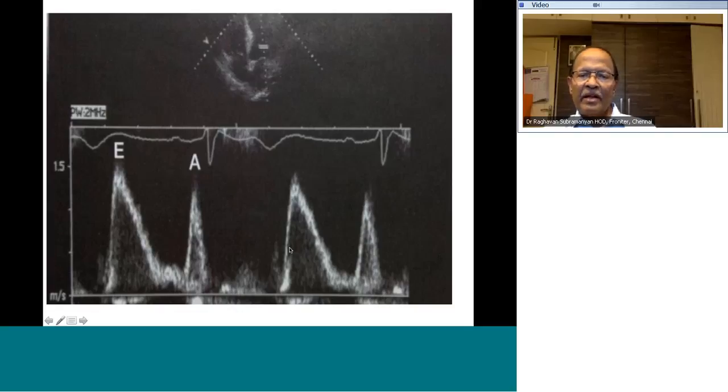It is a clear interior with an opaque border. This laminar flow occurs when all the RBCs are moving at a uniform velocity, and all the velocities are concentrated within this white band. Whereas in very turbulent flow, some velocities are moving at peak velocity and some are moving at a lower velocity. They are moving in different directions within the turbulent stream, and therefore this whole area gets filled up with echo, and that produces what is called turbulent flow.